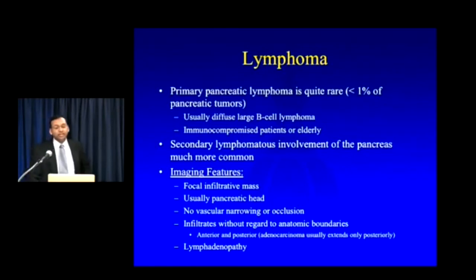And then finally, pancreatic cancer often will metastasize to lymph nodes, but massive lymphadenopathy is uncommon, whereas with lymphoma, big-time lymphadenopathy is going to be very common. So here's an example.